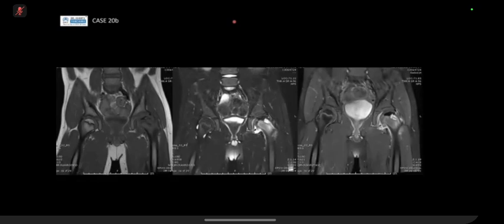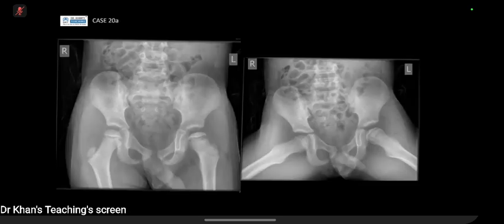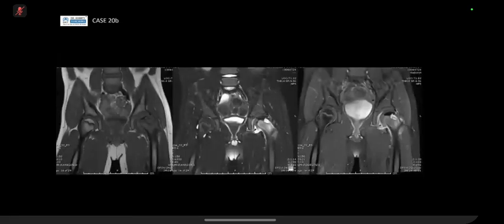So sorry to put candidate 4 in a spot. Candidate 4, do you want to take over? Whether you agree or disagree, you can start from the previous slide. The X-ray is showing that the left femoral head is sclerotic and deformed. The rest of the bones appear normal, so this could be avascular necrosis of the left femoral head. Okay. And then how about the MR?